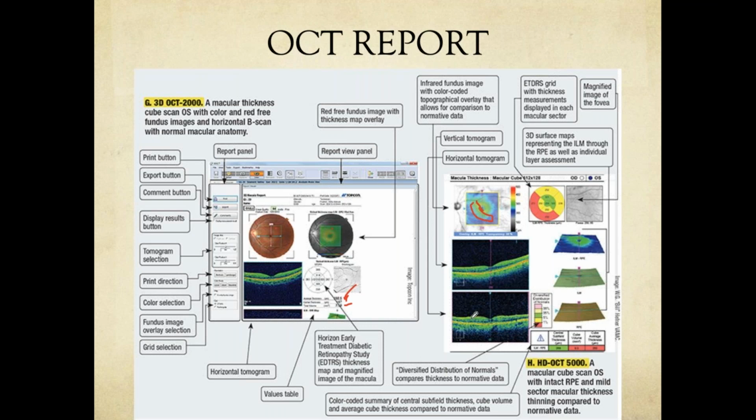So when you see something like this happening over the same layer, distributed evenly around the same layer, only two things can happen. Either it's a maculoschisis or it's some kind of a dystrophy, because dystrophies always tend to follow the germline and always tend to respect the layers.